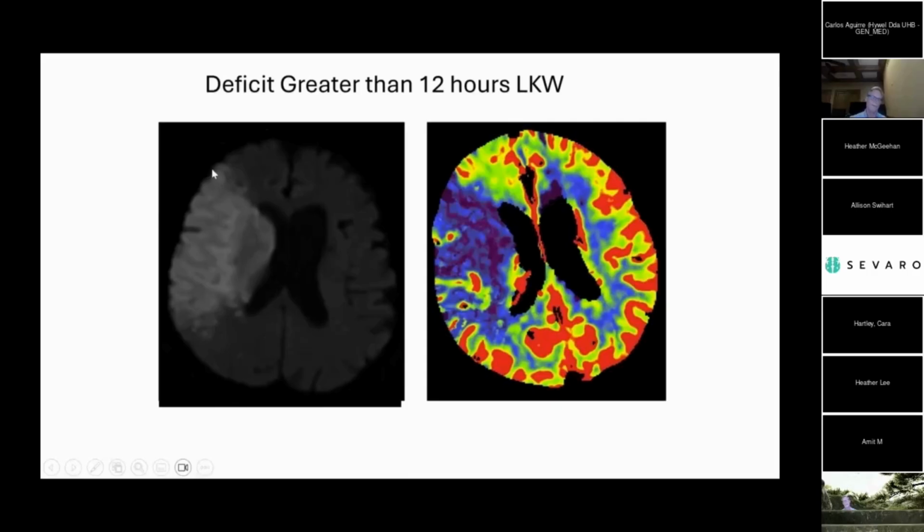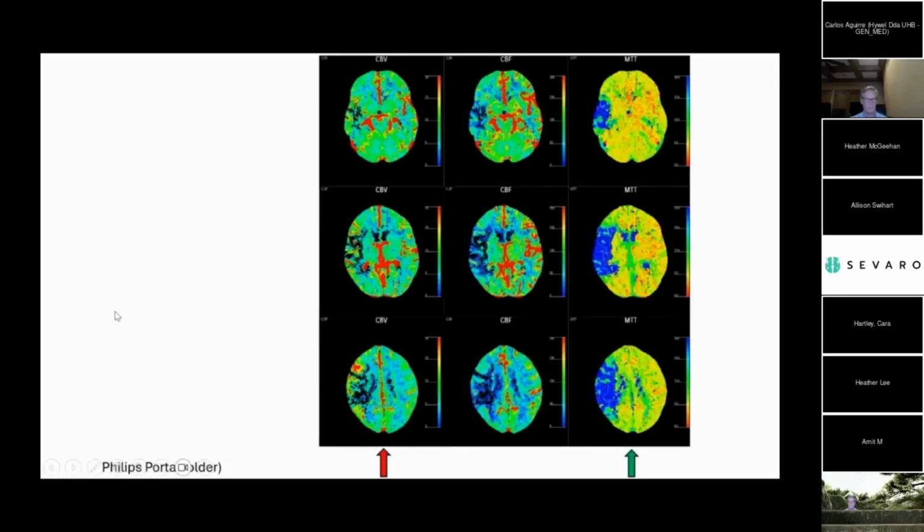So this core infarct is demonstrated by the diffusion weighted image afterwards as the white part. Everything we predicted to be core infarct, regardless of whether I open up the vessel, proved to be core infarct. Also, as you can tell, the edema has already increased. This ventricle now is even more narrow than it was earlier. So again, it gives you information. It also tells you how you can perform should you be successful in opening up the vessel.